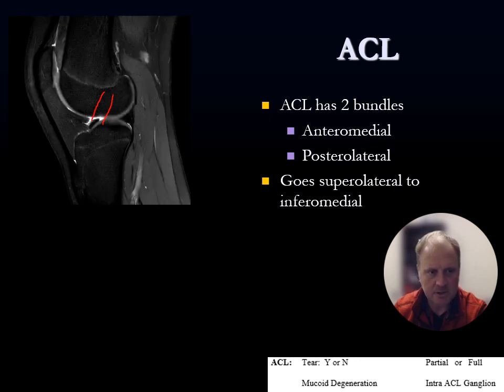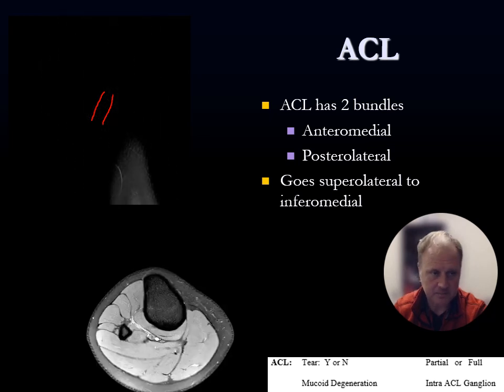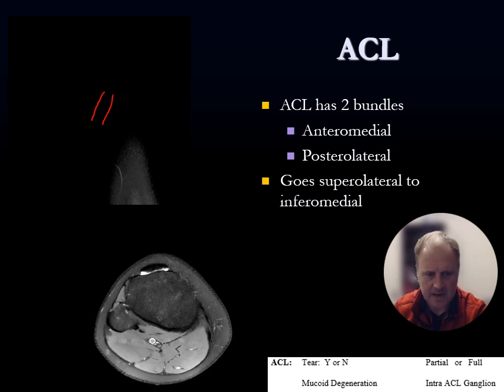That is a normal looking ACL. Now as I go through further, I'll finally get to the other sequence here, which is an axial. This is coming from low to high. And I mentioned here that it goes from superior lateral to inferior medial.